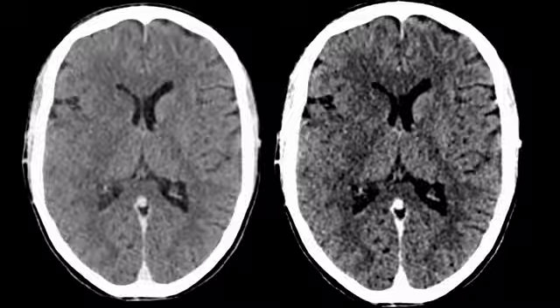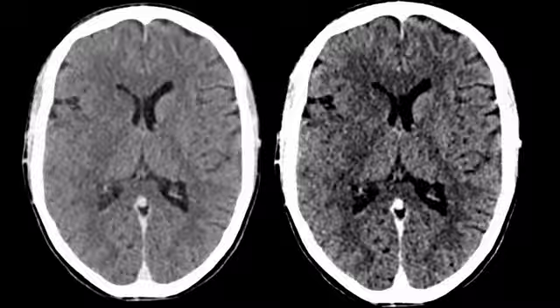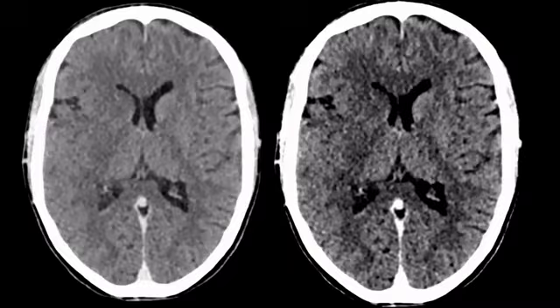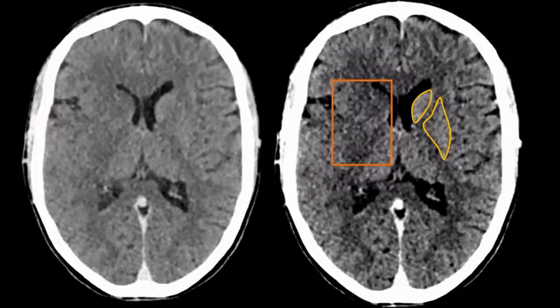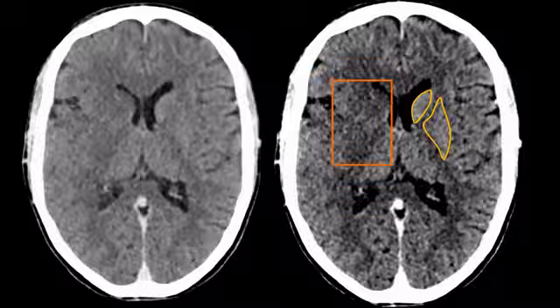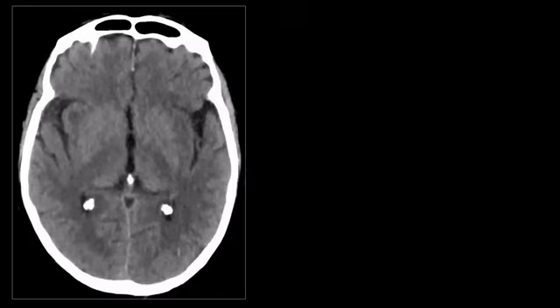Now, the disappearing basal ganglia sign can sometimes be a bit tricky. It can be subtle. What helps is to window our images to generate some more contrast between gray matter and white matter, as I have done on the image on the right side of your screen. And if we now compare the normal left-sided basal ganglia, we immediately recognize that these are absent on the right side. And if you've seen it a couple of times, you don't need to window anymore. You just have to look for it in each and every patient with a suspicion of a large vessel arterial stroke.